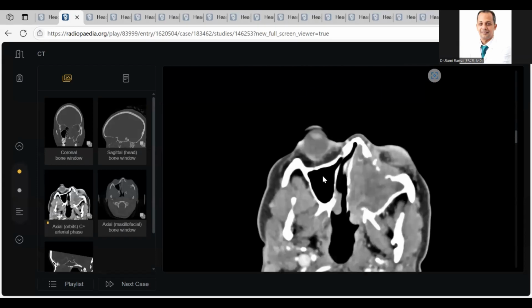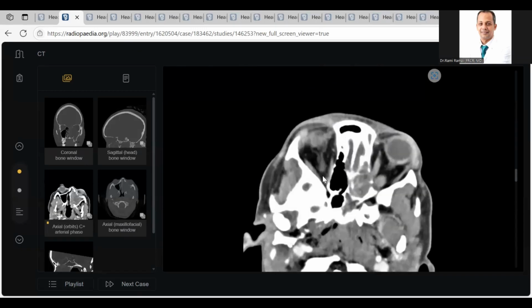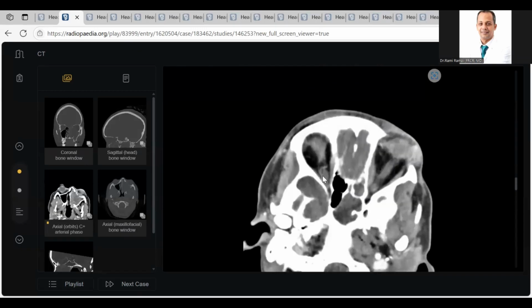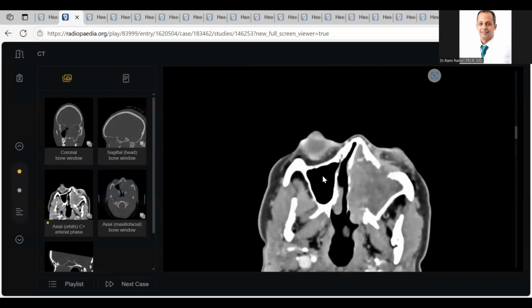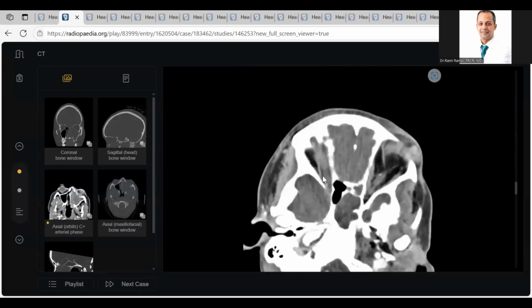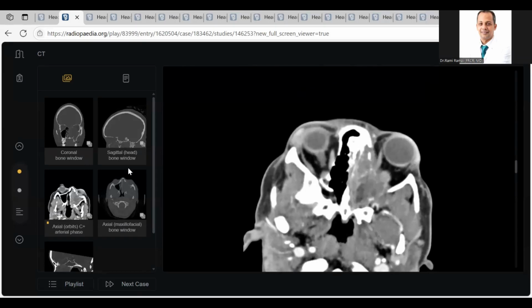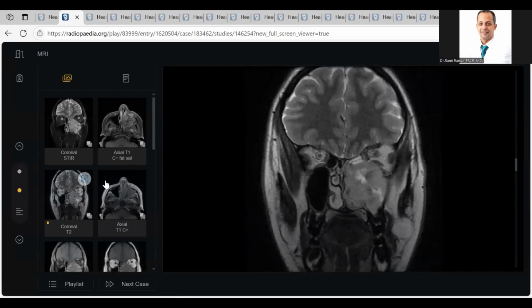This is a post contrast. You saw it. Don't describe again what you described in the non-contrast. Doctor, there is this infiltration, and I have a doubt of brain intracranial extension. My next step is MRI. Like this, my doctors, you will get the highest mark.